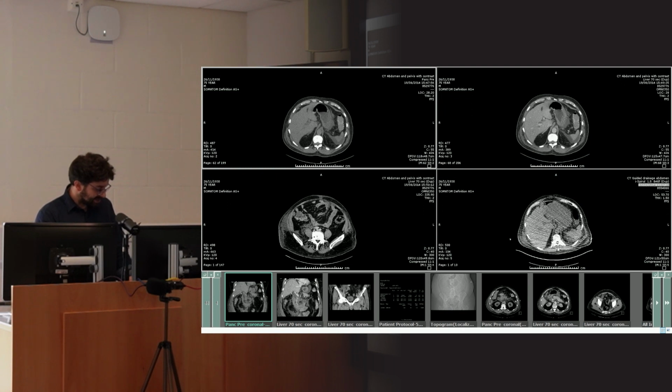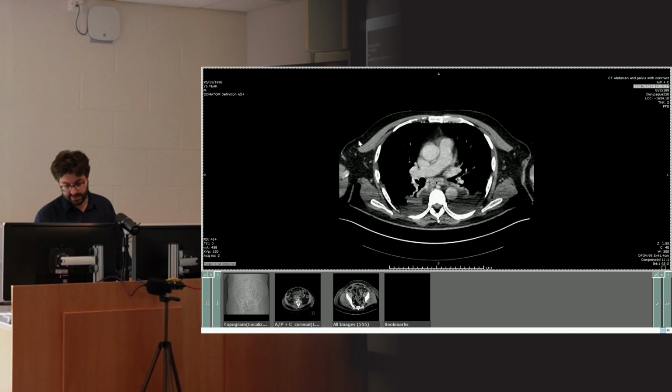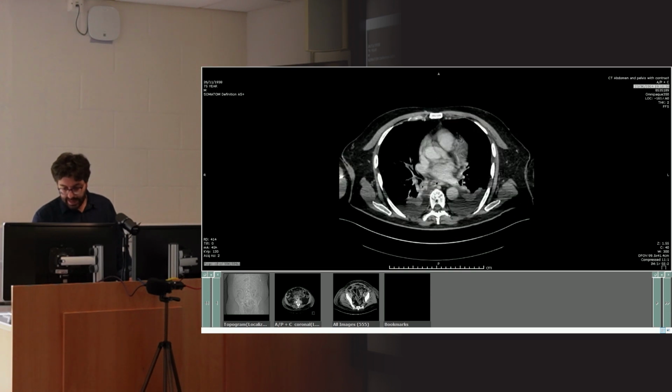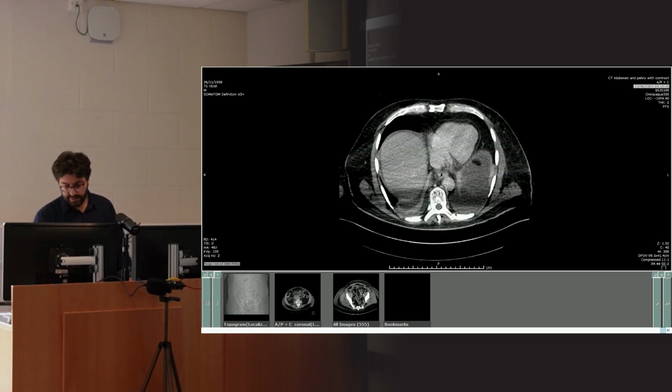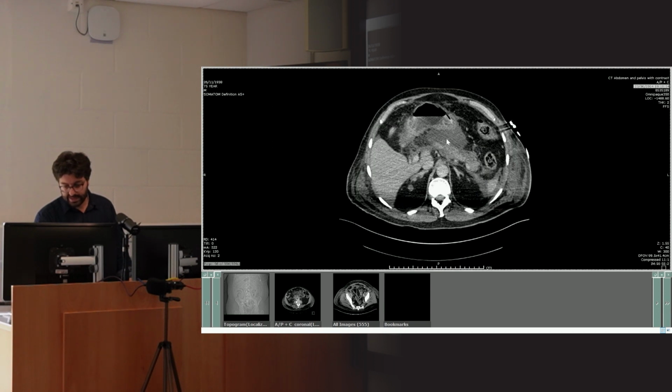And the other things you can look for are complications, because pancreatitis causes all sorts of complications. So this is the scan that was done 4 days later. You can see the patient still got some fluid effusions, loads of fat stranding still around the pancreas. You can see this little pocket of fluid here stuck between stomach and pancreas there.